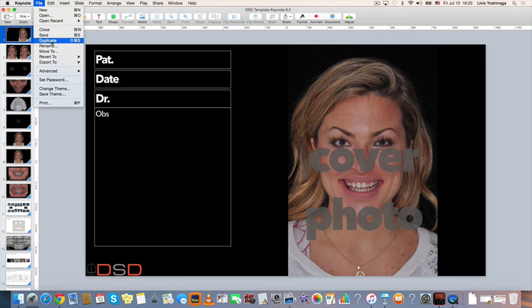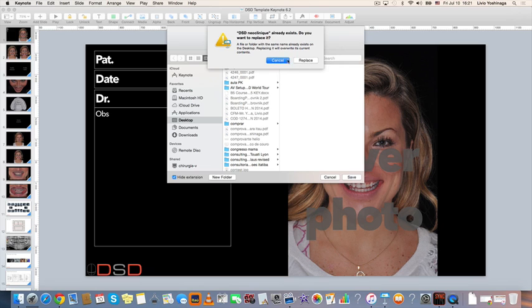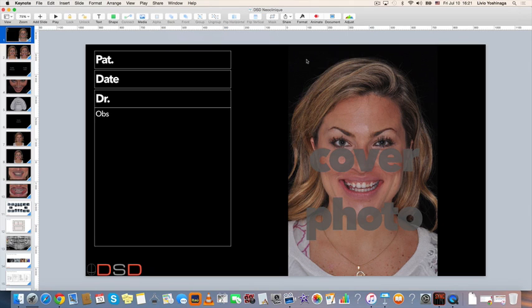So I'm going to duplicate. Instead of duplicate, I go on top of duplicate and I click the Alt key on my keyboard. So this becomes Save As. I click it here and I can give another name. So I'm going to give a name, Neo Clinic. Why? Because I'm here in beautiful Bucharest, Romania, and I will replace the original Neo Clinic. So this is DSD, Neo Clinic. Now I changed the name, and I have saved my original template.